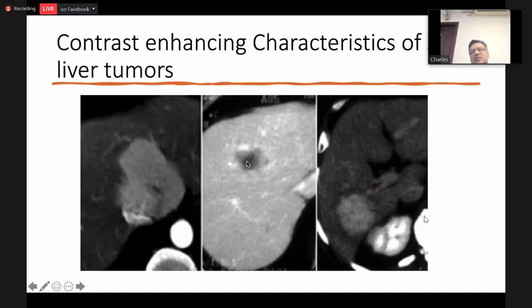And in hepatocellular carcinomas, where there's washout, they become hypo compared to the surrounding liver. And this is a delayed phase, that is the equilibrium phase or the venous phase. You can see the kidneys start taking contrast because they are excreting it, and you can see the hepatic veins become visible in the liver.